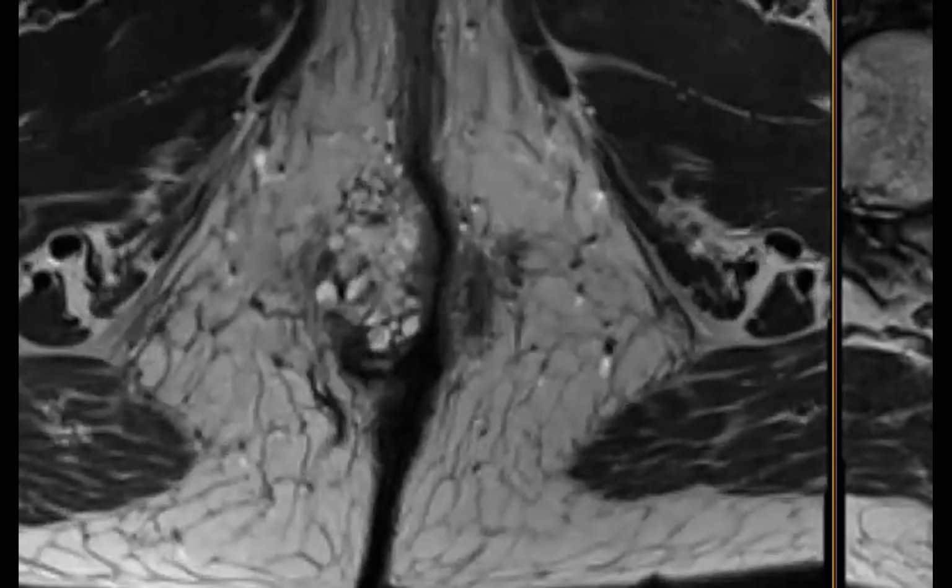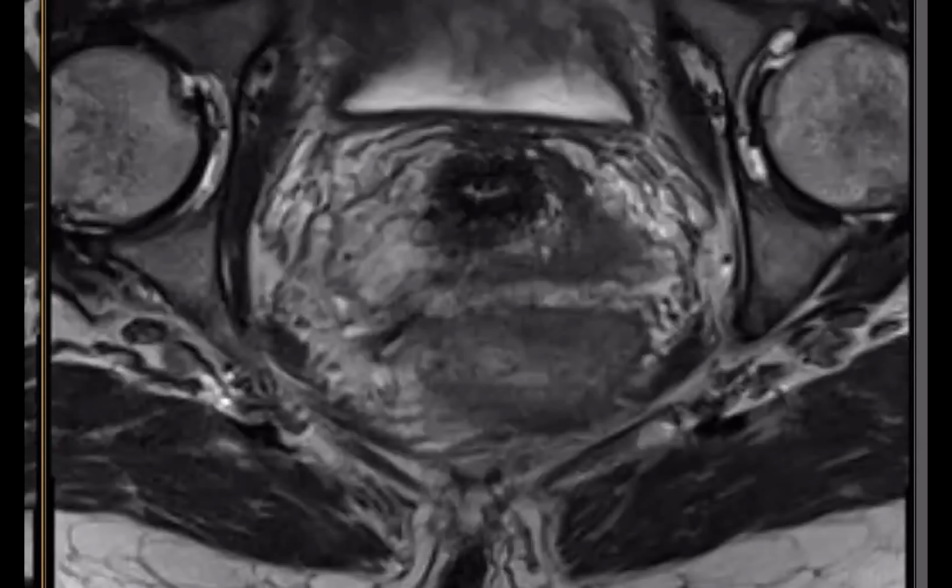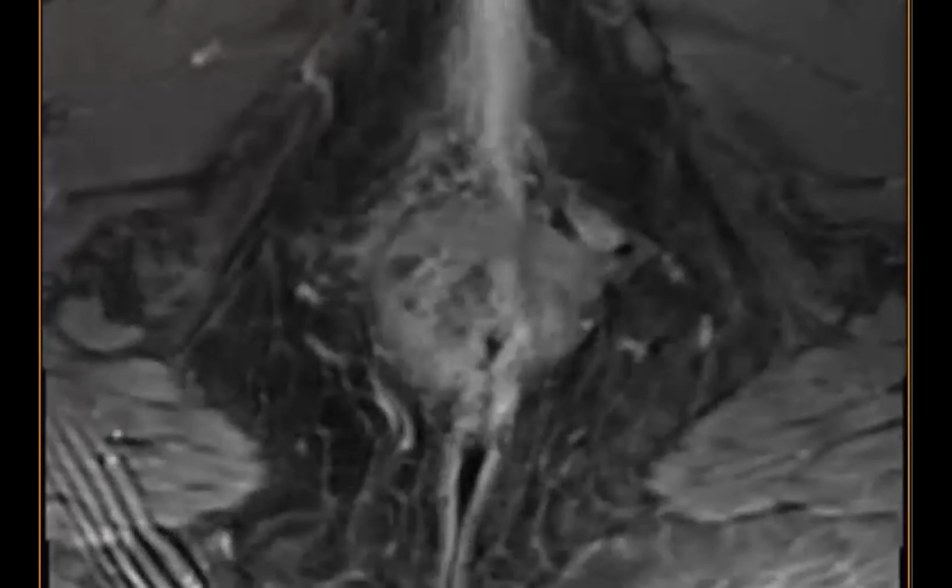And then let me bring up the post-contrast right here. So they do have two transsphincteric fistulae on the same side, and the fistulae terminate in this lesion. Mucinous. Mucinous, yes. Yep. This was called an abscess, and that's the teaching point here.